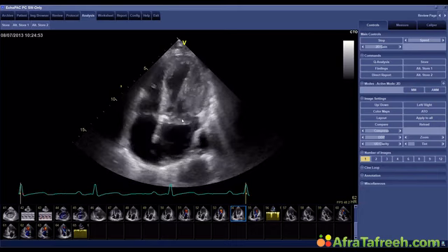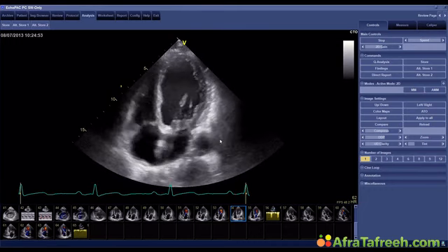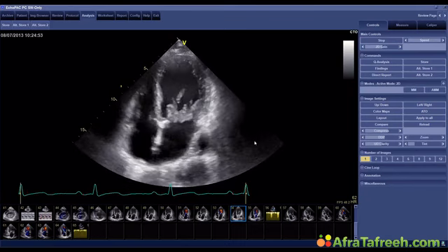So tell your surgeon where the origin is. It will help him in planning the surgery, and it's kind of neat to put it on your report just to show that you know more about the morphology of the mitral valve than many other people do.